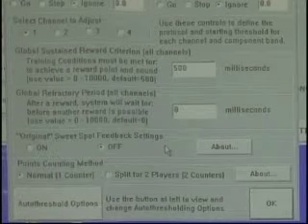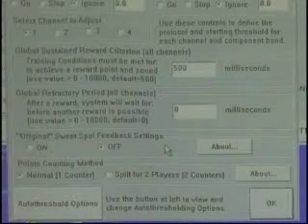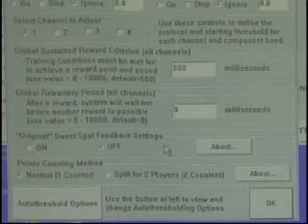Okay. Another question: what would you do? Use MIDI tones and use sustained. Okay. But we'll get to that more from the sound feedback screen.